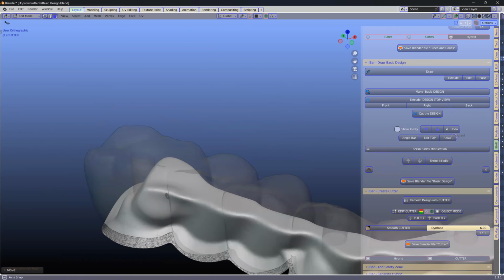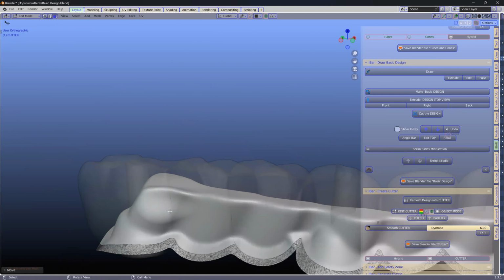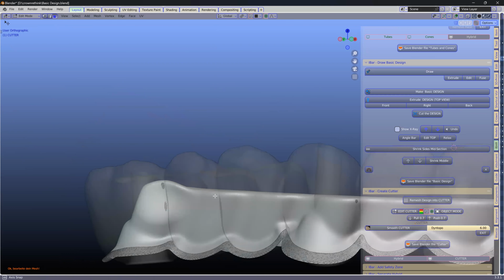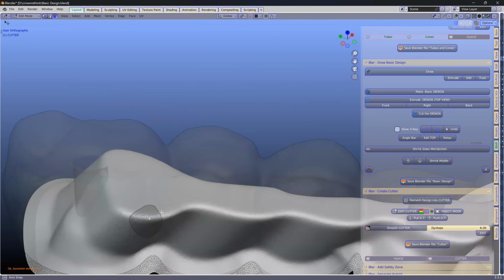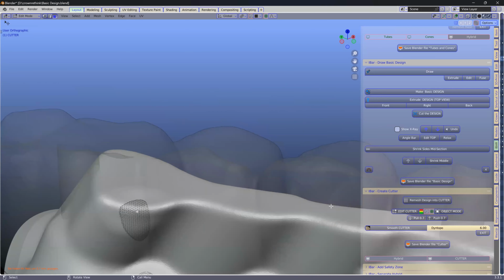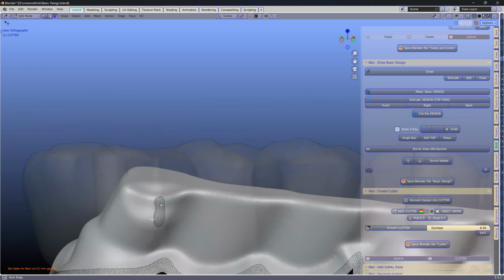Now you have to make sure, with logic prevailing, that we don't make undercuts. So you're not going to move the mesh in the middle or something. Also, you're not going to move this mesh on the outside, because otherwise you're going to create undercuts. We don't want that. So an alternative is to look at it at like 45 degrees and then push it by 0.7 millimeters inwards. That's like taking your thumb and just pushing it in. So that is an alternative as well.